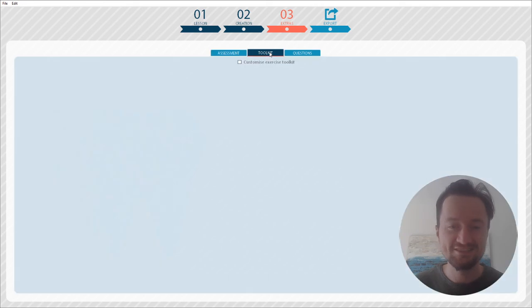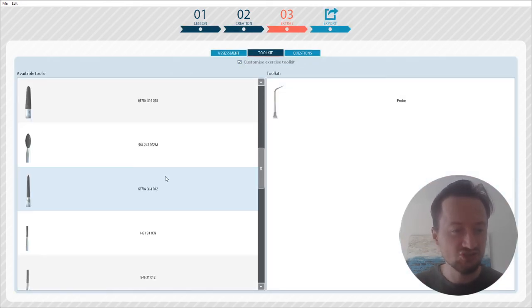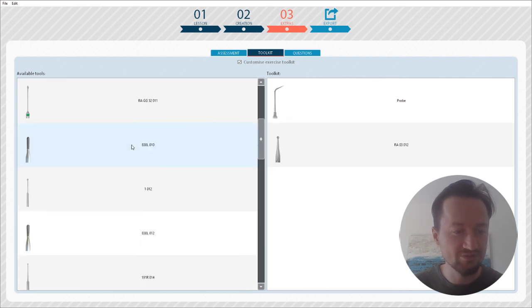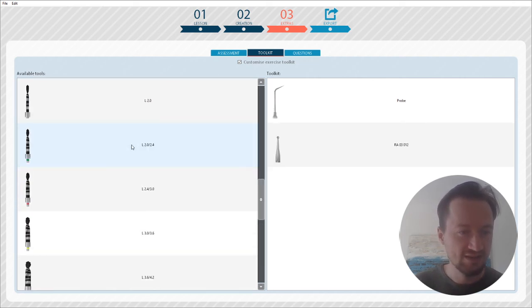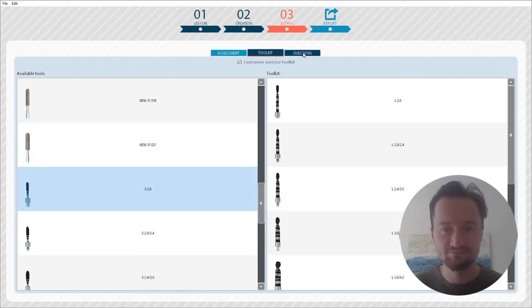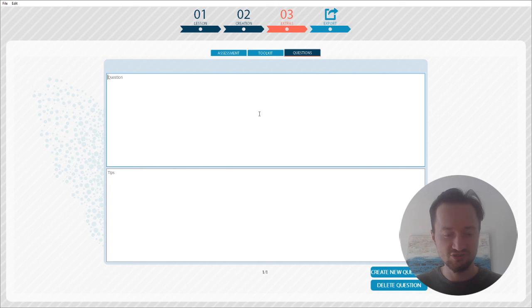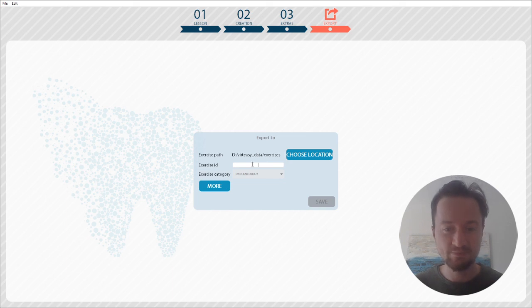And then I can go ahead to the toolkit, customize the exercise toolkit, and then I can give the students only the burrs I want them to have. So I might go ahead and choose some of these ones from implantology, and then I can go ahead and set questions. To set the first question, I just click down here, create new question, and are you happy with your result? This is going to appear as a yes no question for the students, and when I'm ready I can go ahead and click export.